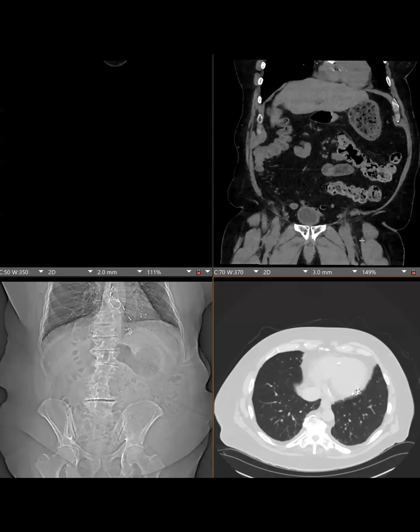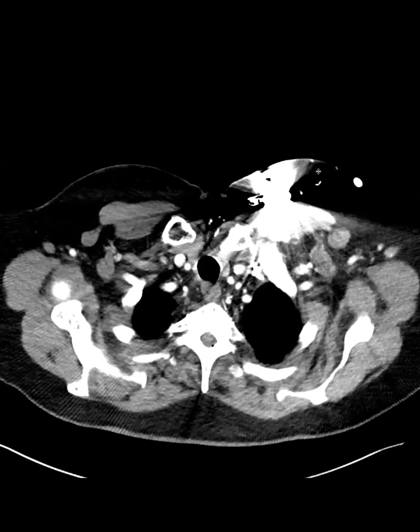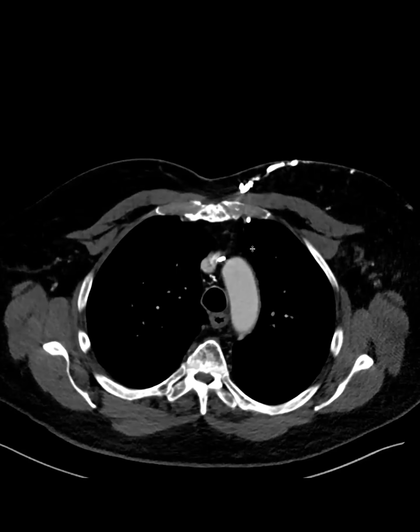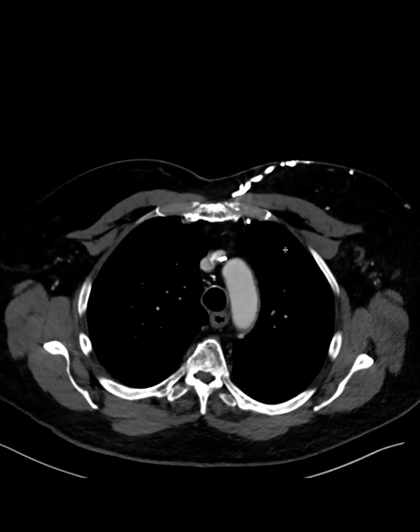So this is a patient who, any guesses as to possible explanations for this? I mean, sometimes we see air in veins if they've been injecting into veins, but these seem to be random. Oh, yeah. So yes, this patient has severe SVC stenosis. So the air comes from what was administered through the IV contrast.